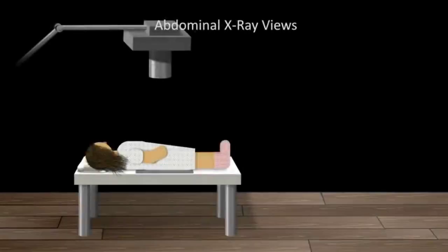When it comes to x-ray, you only need to know a few basic radiographic densities. We have air, which is a very low density and is going to show up the darkest, and very, very dense structures like bone and metal are going to show up as very bright. In between, we have fat, and then we have water and soft tissue. Fat is less dense than the water and the soft tissue.